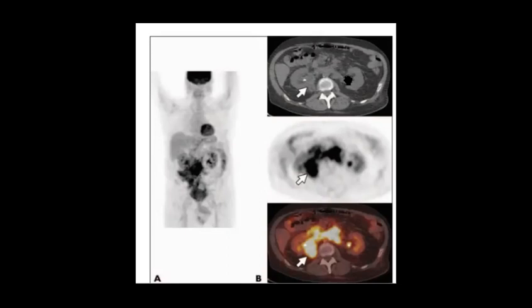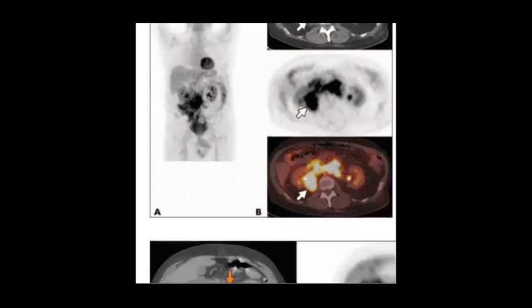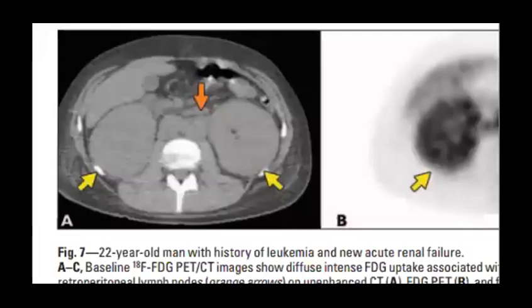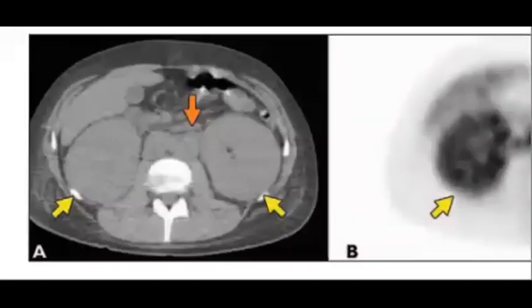Maybe this is what makes the appearance of these stents. Okay. So this is what's called myeloid sarcoma. I think this is similar to leukemia or something. So this one is solved because I showed you the answer.